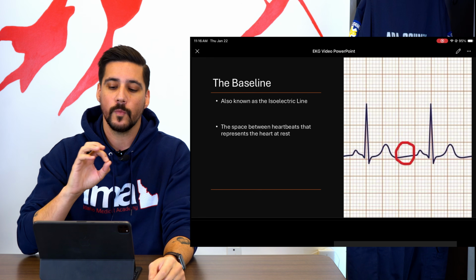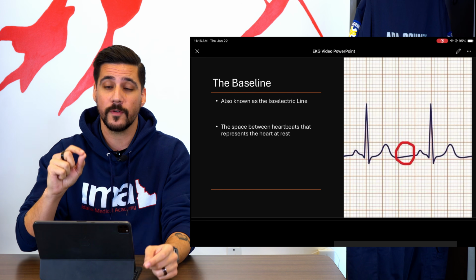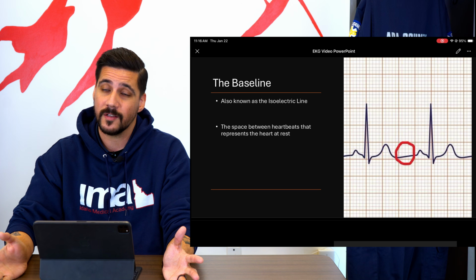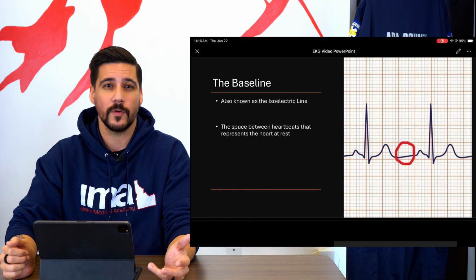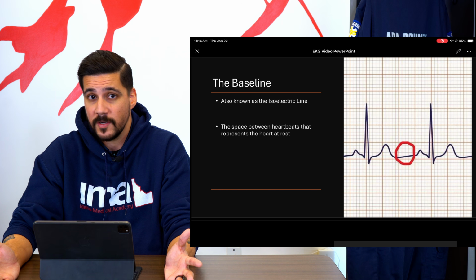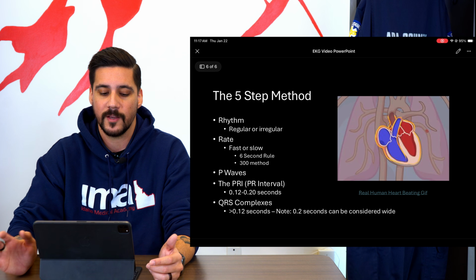Once again, when you're doing this, look for the complexes. Like I said, those strips get long, but look for the complexes that lie on those big lines, because if they're going fast enough, likely one of them will. Okay, it's a really good identifier, and it's a quick, down and dirty way to get an answer if you just have to find an answer quickly, right? You're not necessarily going to spend the time counting the boxes.